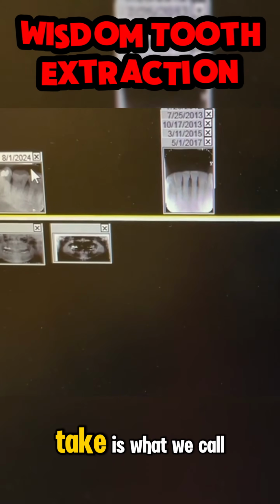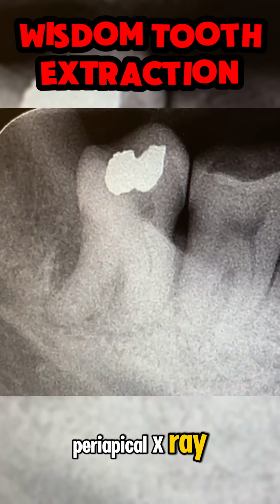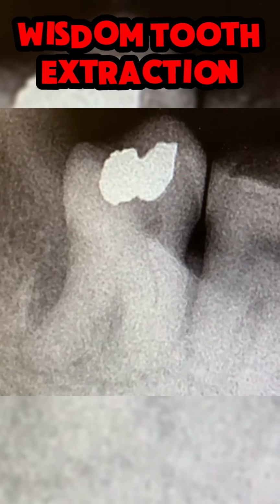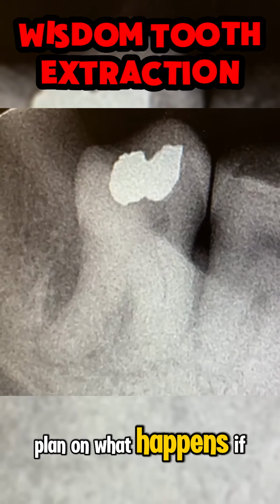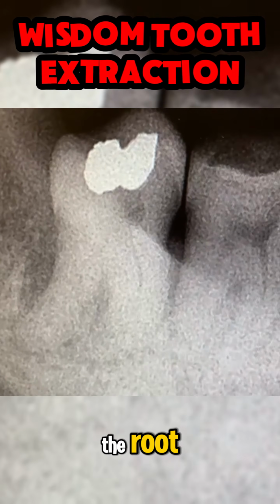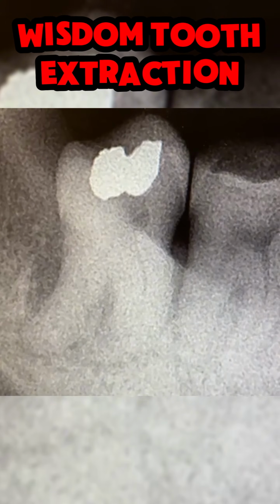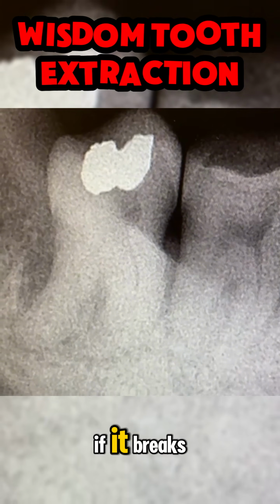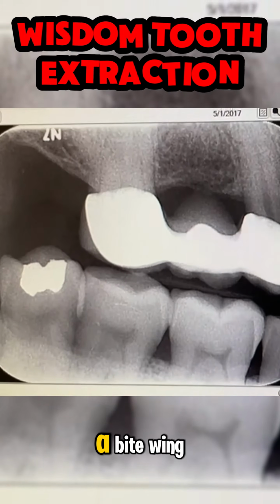Another x-ray that we take is what we call a periapical x-ray, which will show that that tooth has a curved root, and we have to plan on what happens if that tooth breaks right at the tip of the root. So we've got to make sure that we avoid having to retrieve that root if it breaks. Another x-ray that can be taken is what we call a bitewing.